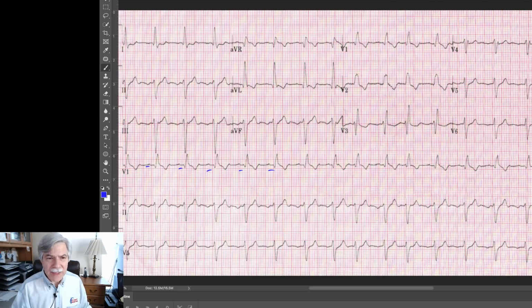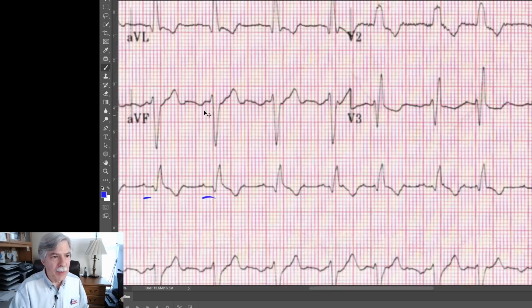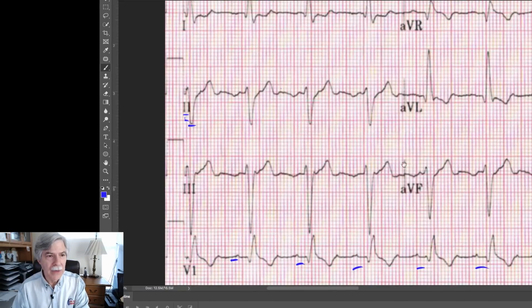But you always have to look a little bit more carefully when something doesn't fit right. So what I see in lead 2 is atrial flutter, and I'll show you why. I can make this a little bit bigger and drag this around. Here in lead 2, what you're seeing is a downsloping segment that rapidly resolves, and this sawtooth pattern is seen throughout the whole picture.